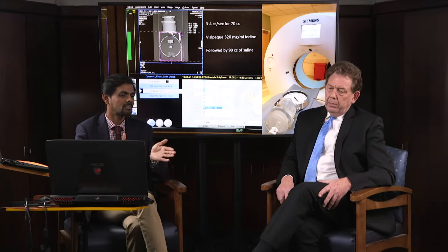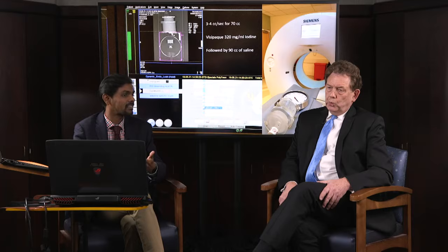So if the patient has a type 1 and a type 2, and if we took our delayed picture earlier, we will only detect type 1. We might miss type 2. If we took a later picture, we might miss an early type 1, and we probably might see only type 2. Or even the dye might have washed out and we may not see anything at all. We might falsely say, oh, the patient is fine, but the aneurysm might progress.